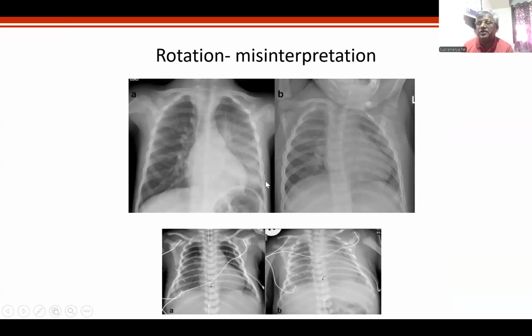What happens to misinterpretation on a rotation? I'll just give you one or two. Dr. Bora, I will repeat about vascularity again when I discuss LRTI. Now here, misinterpretation of rotation happens. For example, look at my chest now. One side of my chest becomes more anterior or posterior based on my rotation. Did you understand? So the unilateral hyperlucency or hypolucency also depends on rotation. Please type U if you have understood.